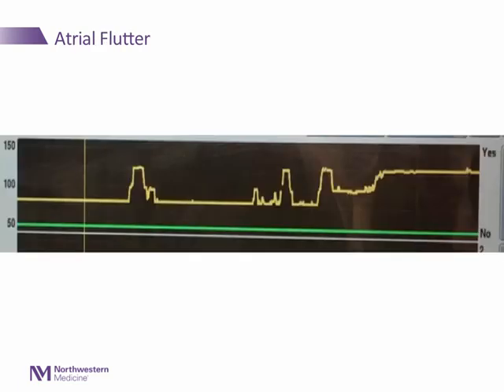This is an example that is suggestive of atrial flutter. Unlike atrial fibrillation, in general, atrial flutter is regular and thus the baseline is not particularly thickened. Also, the rate of atrial flutter is determined by the degree of AV node conduction and is usually 2-to-1 at a rate of 150, but can also occur at 3-to-1 at 100 beats per minute or 4-to-1 at 75 beats per minute. Thus, as in the example shown here, the graphical trend can often appear like rungs of a ladder as the heart rate changes between these various multiples.